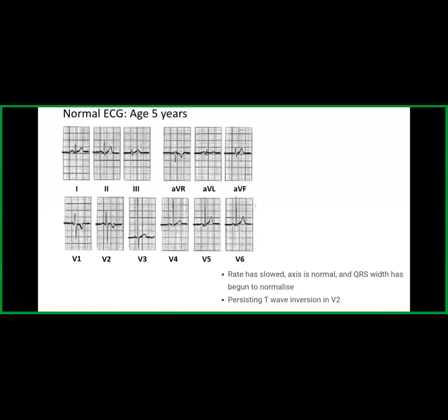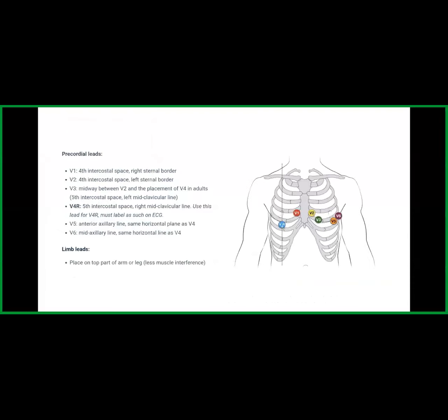If you see, even at 5 years, the persistence of T wave inversion is seen. So T wave inversion seems to be a normal finding in a child until 10 years of age. When the child reaches 10 years, this T wave inversion is gone.